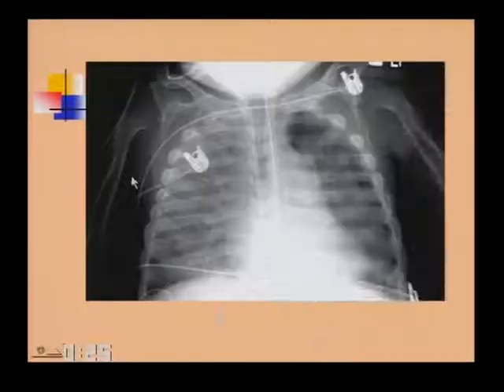This is a skeletal dysplasia that you may not recognize per se, but when you looked at it with the narrowed metaphyses and the oar-shaped ribs, you would be able to get enough information by looking at the study and talking to your clinicians that you would be able to put this in a category. This is one of the mucopolysaccharidoses.